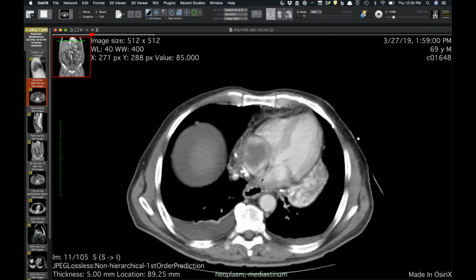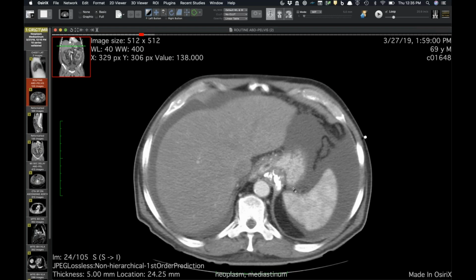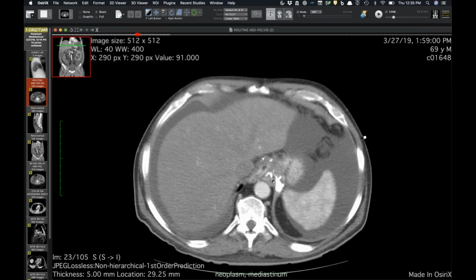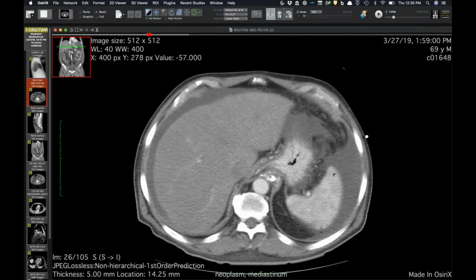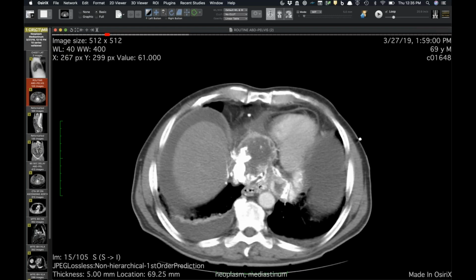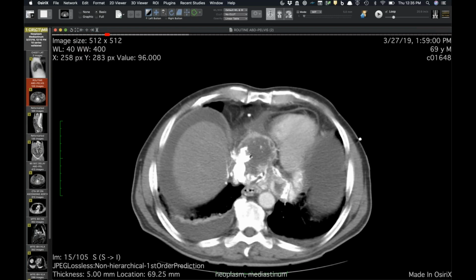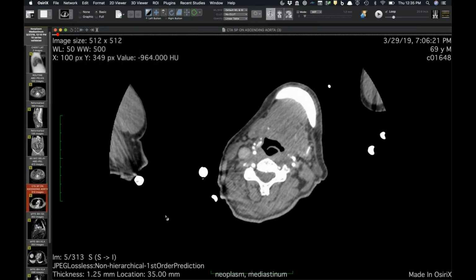coarsely calcified. And what's interesting is it's hard to really say where this is, if it's in the pericardium, if it's in the mediastinum surrounding the pericardium. I actually was curious about the fact that some of this was along the crus here, the left diaphragmatic crus. You can see all the edema and whatnot in his belly. And so when they showed this to me, it's encasing the IVC here. Certainly you think of tumor. I wasn't sure this couldn't be some weird form of tuberculosis or some granulomatous infection, given that it was a patient that was from Mexico and it had TB in the past.